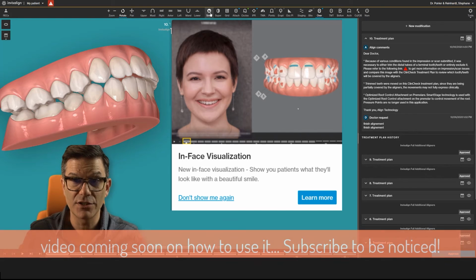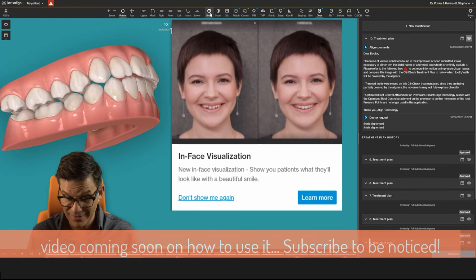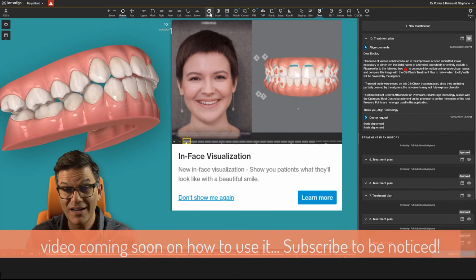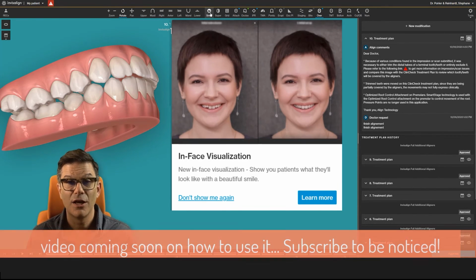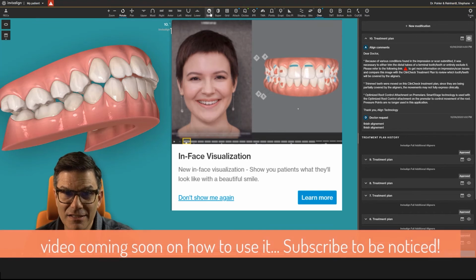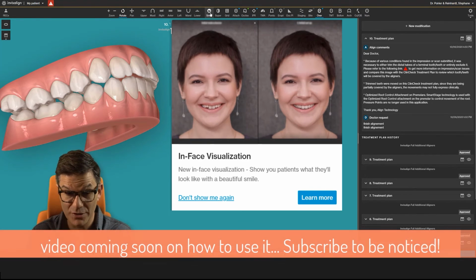If your hygienist or assistants are taking the picture, it guides them how to take pictures. It uploads your pictures automatically in your patient's file on your Invisalign doctor site. But there's a new picture now with a big smile that you can take. And if they take this picture and the picture is good, they really guide you.